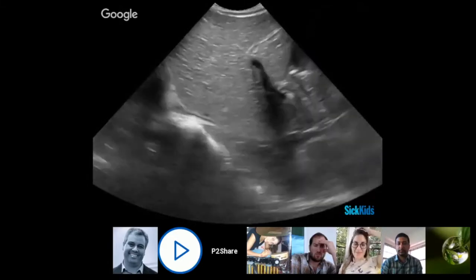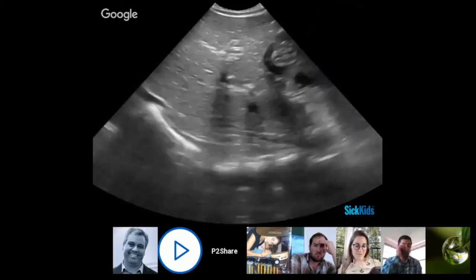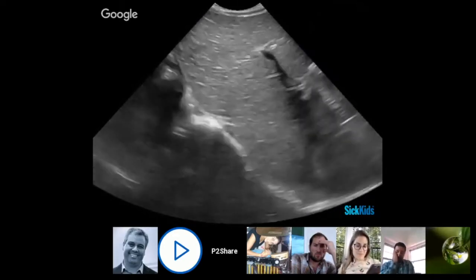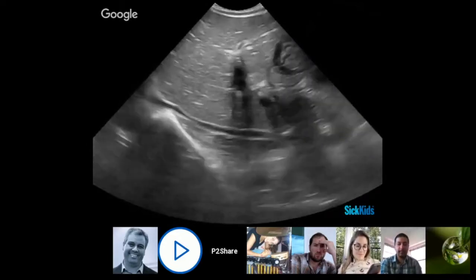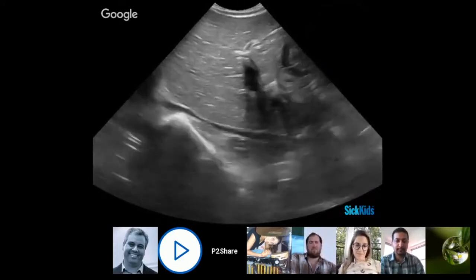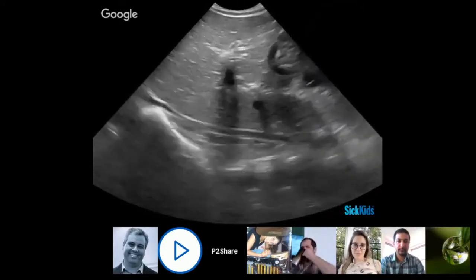And so, while it's important to maybe know that these things exist, and maybe in the future we'll determine some valid way of using them clinically, we just haven't seen on a day-to-day basis that Caval index and these sorts of things are going to be changing how you approach a patient beyond you qualitatively looking at an image like this and saying, yeah, that IVC looks pretty underfilled.